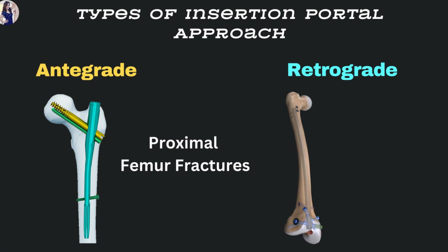The antegrade femoral nail system is intended for use in intramedullary fixation of fractures of the femur to include the following: open and closed femoral fractures, pseudoarthrosis and correction osteotomy, pathologic fractures, impending pathologic fractures and tumor resections, bone lengthening, fractures proximal to a total knee arthroplasty or prosthesis, non-unions and malunions, fractures resulting from osteoporosis, and fractures in the proximal femur.